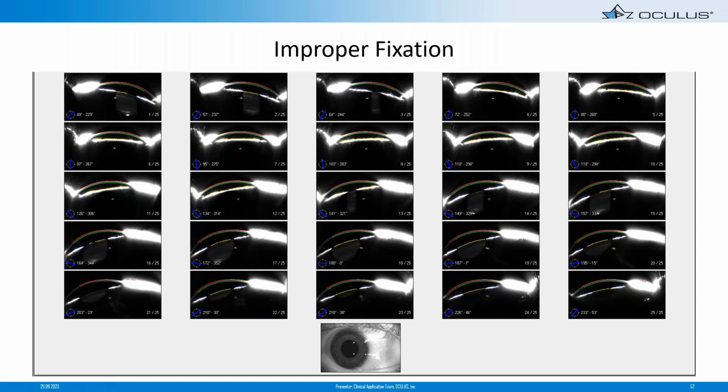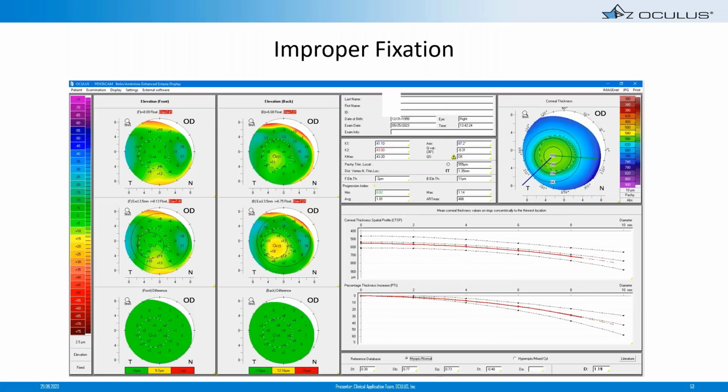And the easiest place to tell is down below at the iris camera image. You can see that that patient is looking eccentrically. And what that translates to, when you look at the BAD map, it elevated the BAD value. While it didn't turn yellow, it elevated it quite significantly. So again, we have abnormal capture diameters, flagged red on the front, flagged red in the back. Even though the QS is white, we still know that this is a poor fixation and we can't rely upon this data.